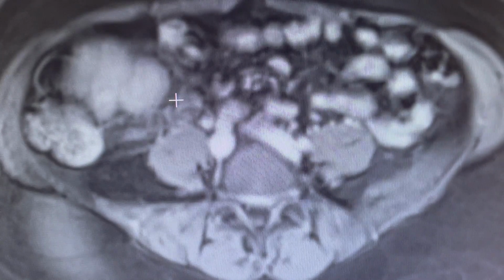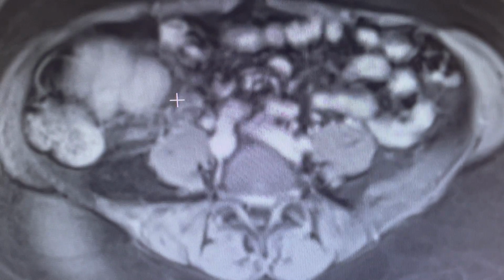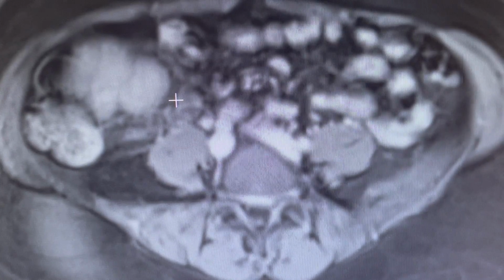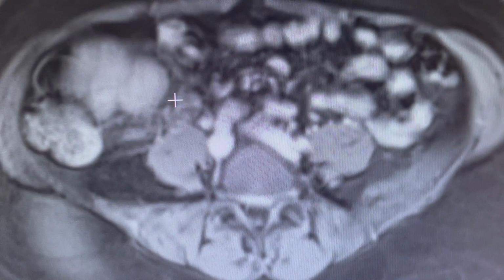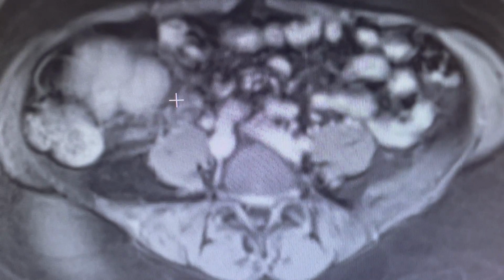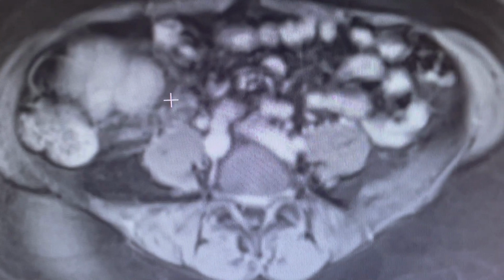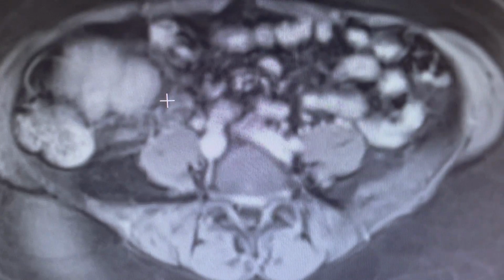So, in all of my experience of looking at the liver, there's 4 types of lesions that can cause high signal intensity on arterial phase images as large categories. 1, hepatocellular carcinoma and family members of it, such as high-grade dysplastic nodules. 2, hypervascular liver metastases. 3, hemangiomas. And 4, focal nodular hyperplasia, and the family of hyperplastic liver lesions.